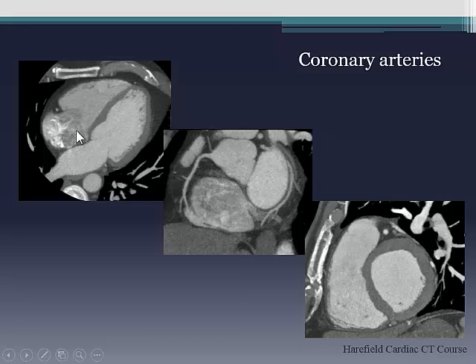Okay, so as you head south now, you get into the interventricular groove, and again, you can see the LAD runs here and the PDA runs there. And remember, here you can see the LAD nicely cushioned around with epicardial fat. Sometimes you'll see it's kind of sitting right in the muscle. And this is a really good view if you want to understand bridging. And, you know, for those of you who do angiography, bridging, people say about 3%. It's probably about 30% on CT. We see it all the time. Obviously, the significance is a bit dubious, but anyway, that's another story.